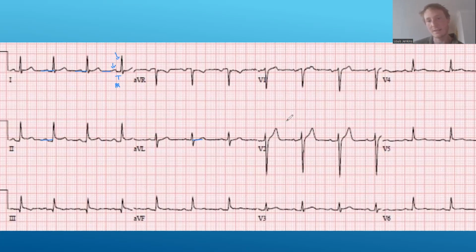Looking at our anterior leads, we have good R wave progression. That looks normal. V1, V2 look normal. V3, we have some ST elevation here. V4, we have a tiny bit of ST elevation as well. V5 is a little bit elevated, and V6 is a little bit elevated. So a lot of what I'd describe as pretty minimal ST elevation, but global and probably meeting criteria. I'm not going to count it, but I imagine in these inferior leads we're going to be more than a mil of elevation. So I think this patient's probably meeting STEMI criteria.